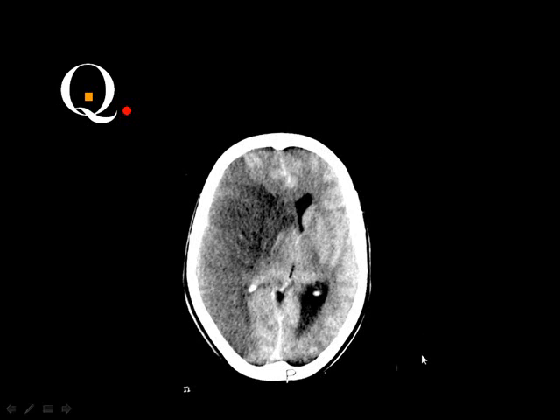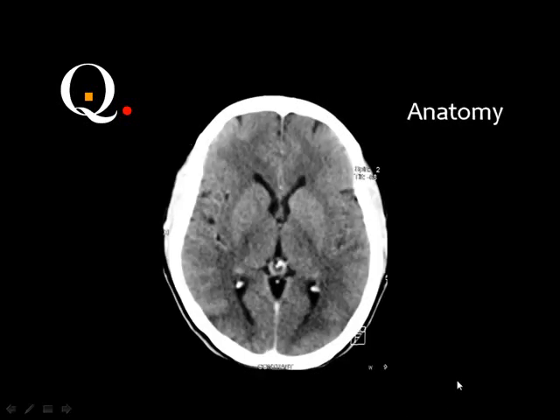Infarction, chronic or subacute? Acute. And this is the usual way in the exam also. If there are 3 choices, they say to you the 2 choices which are not the answer, okay? Then you be aware of this. If this is an acute infarction, they say to you, is it a subacute or chronic? Then you will say one of 2, and you will lose the mark.